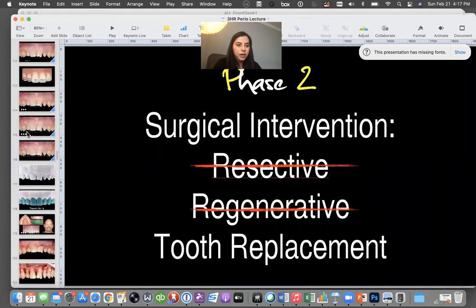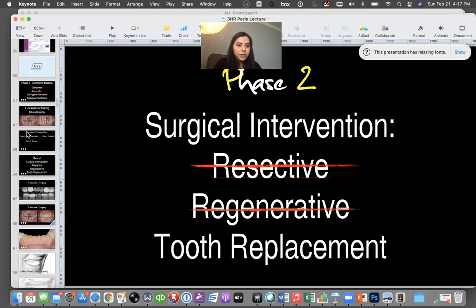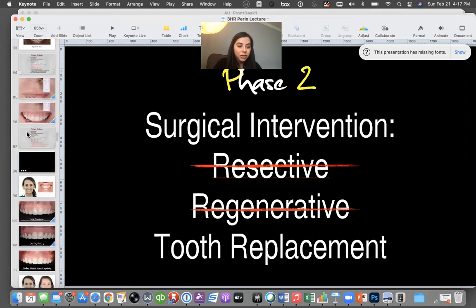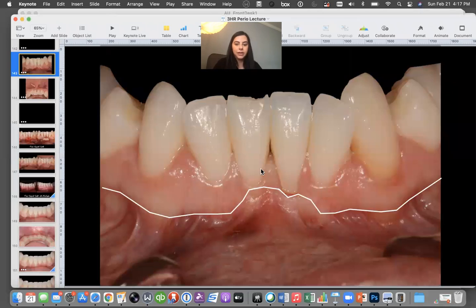Okay, so let's talk a little bit about this actual gingival margin and what does gingival margin actually mean? So gingival margin is the measurement of recession on a tooth. If you were to look at a case like this right here, this is a good example. This patient, you can see in the front, has some recession on these lower two front teeth. So these lower two front teeth, if I were to chart gingival margin, we would chart 0, 0, 0, 0, 0, 0, 0, 0, 0, 0, 3, 1, 1, 2, 1. So when we're measuring the actual recession, we're measuring this area of exposed root surface. That is the gingival margin on the periodontal charting, okay?